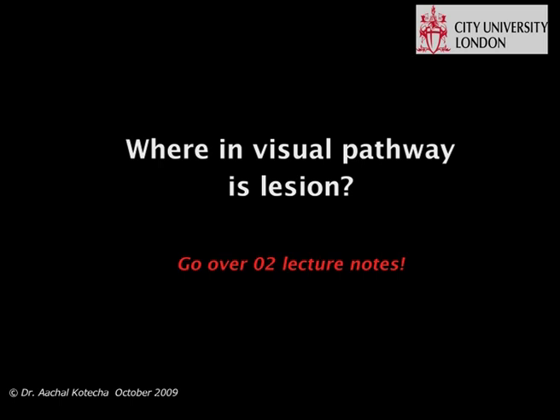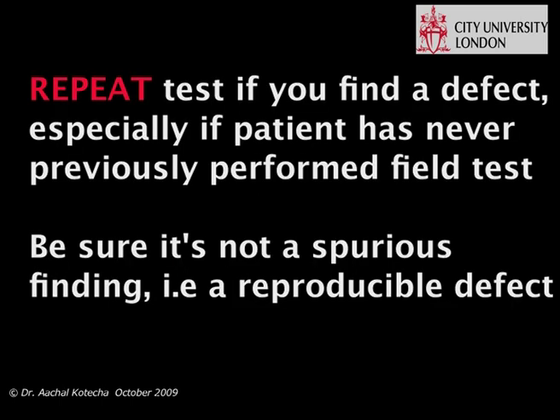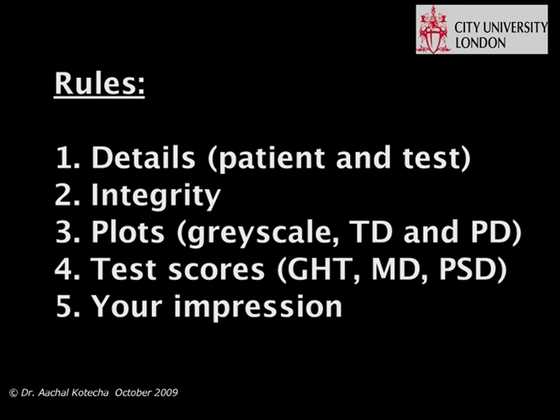And remember, it is important to repeat the test if you find a defect, especially if it's the patient's first ever test. You want to be sure that the defect is reproducible and not just a spurious finding.